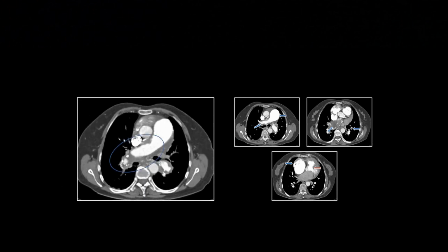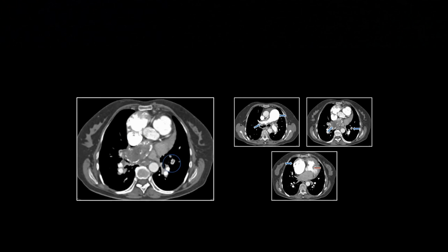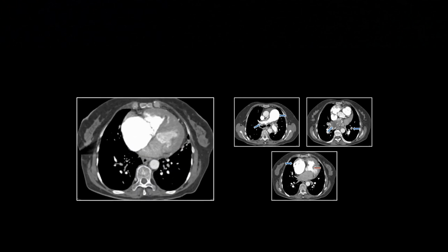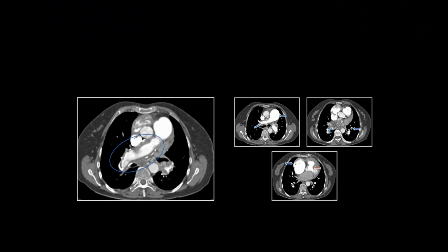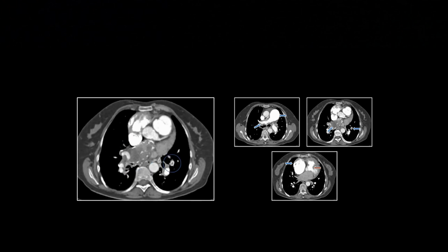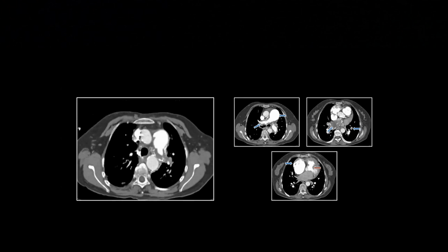It's interesting, with a VSD, you definitely will get hypertrophy of the right ventricle, but one of my old attendings used to say, with VSDs, you don't get that much right ventricular enlargement, chamber enlargement. And you can see that's the case here. I mean, it's a little large, but it's actually, I don't think, as enlarged as the case we just saw earlier. And the reason is apparently that the right ventricle doesn't suffer from volume overload as much, and it's the volume overload as opposed to pressure overload, right, that leads to chamber enlargement.